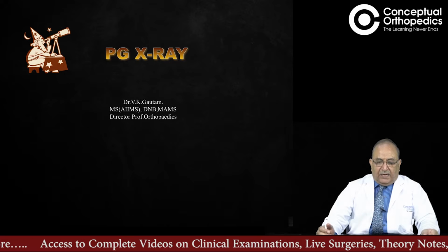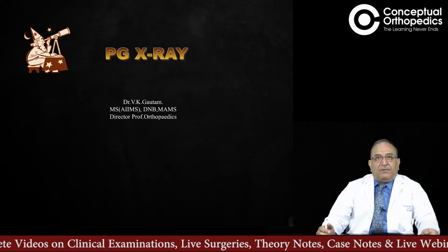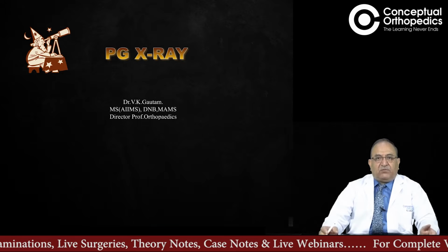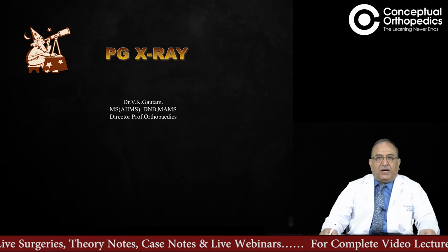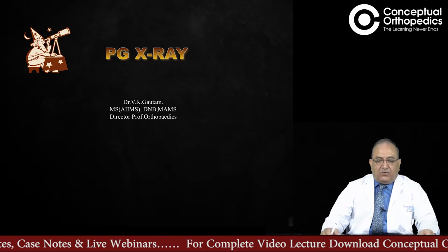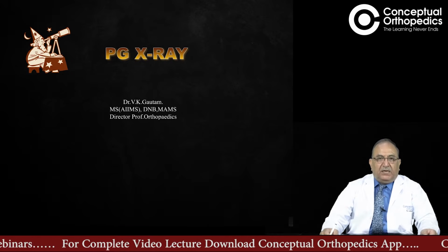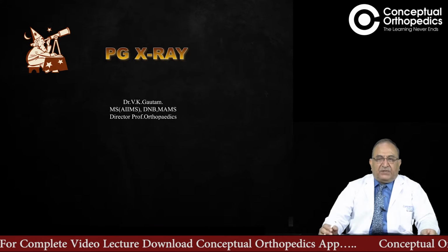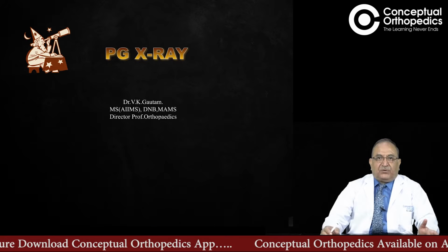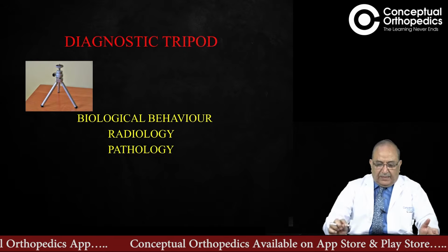And I would like to advise the MS and DNB students particularly that whenever an X-ray is shown, don't be judgmental and immediately try to give a diagnosis, because as in a long case or short case, you are expected to support the diagnosis with the findings of the X-ray. So it is desirable that you first pick up all the positive findings in the X-ray, and based on that you give a final diagnosis. So with this, we'll start the first X-ray.